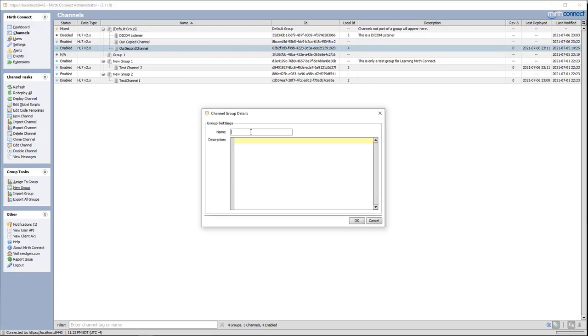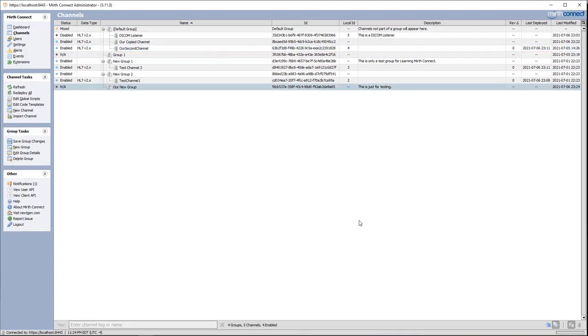We'll say our new group. We can give it a description. This is just for testing. Click OK. And our new group is here. Now we need to save our group changes.